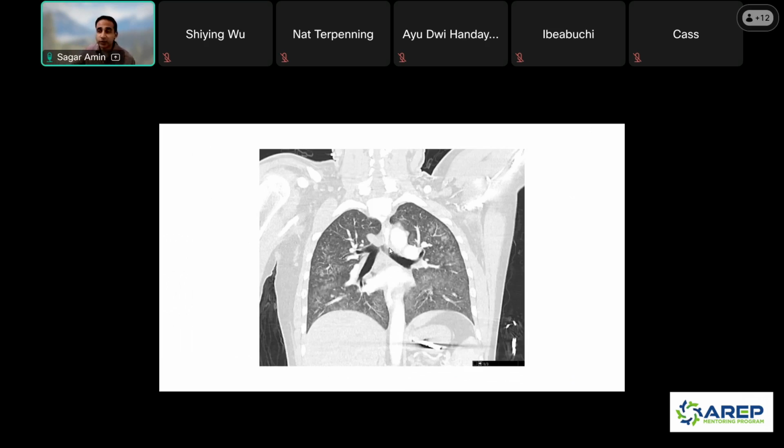This has more of a nodular look, and fat emboli can have both a more confluent ground glass look, as it affects more of the secondary pulmonary lobules, or a more nodular ground glass look that can also look somewhat confluent. But the distribution is the same, that more central distribution of ground glass opacities.